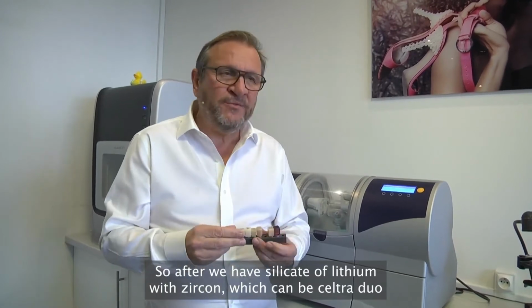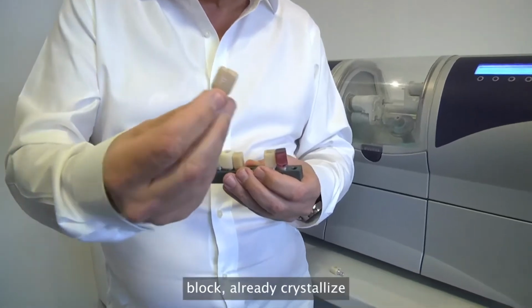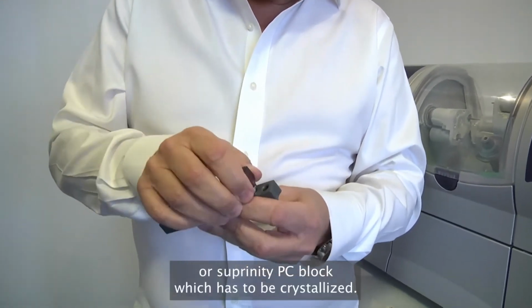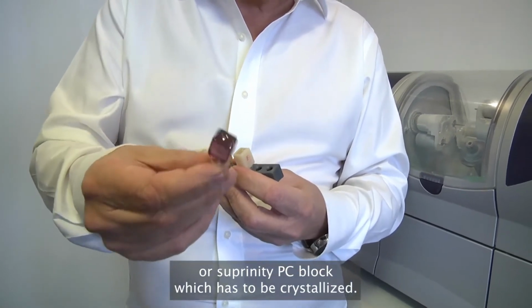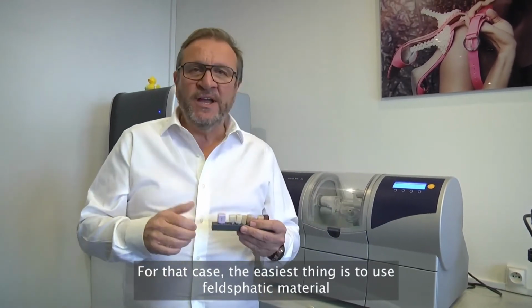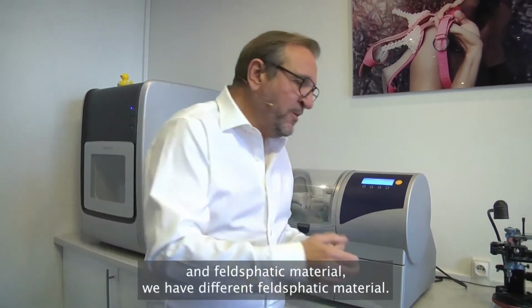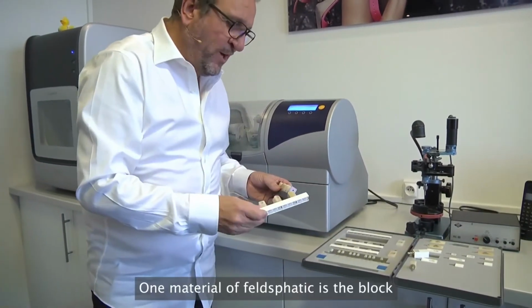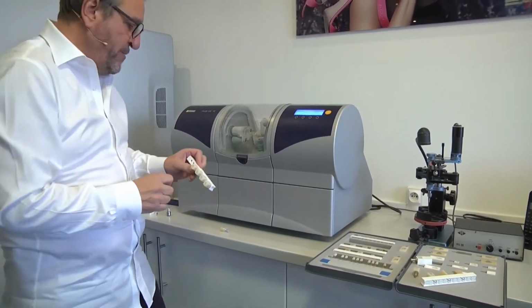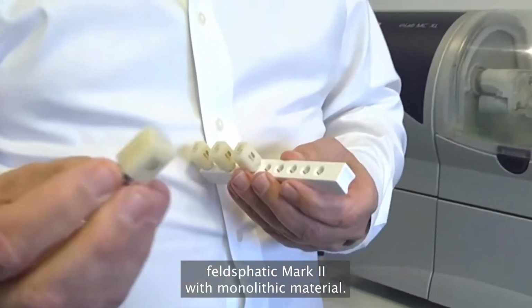So after, we have lithium silicate with zircon, which can be the Celtra Duo block, already crystallized, or the Suprinity PC block, which will have to be crystallized. For that case, the easy thing is to use feldspathic material. And with feldspathic material, we have different feldspathic materials. One feldspathic material is the Mark II block, a monolithic material.